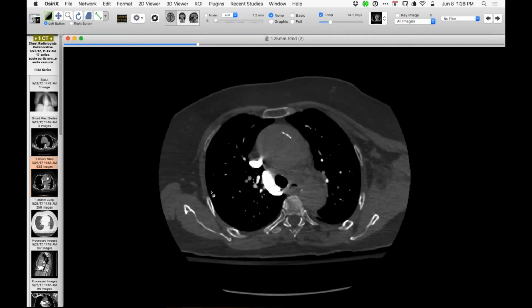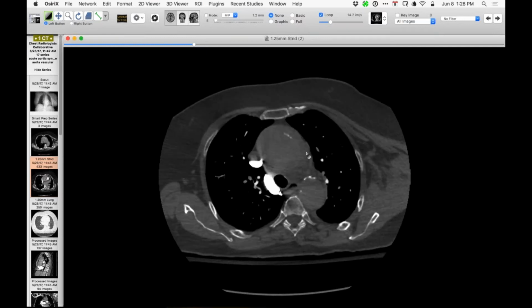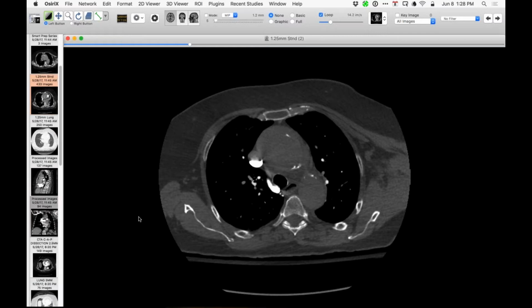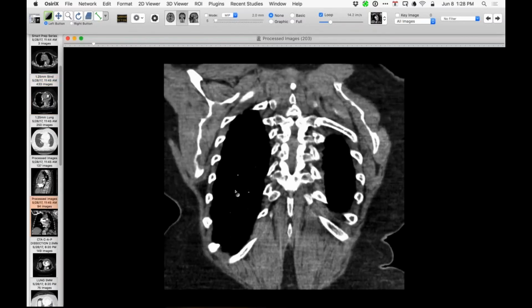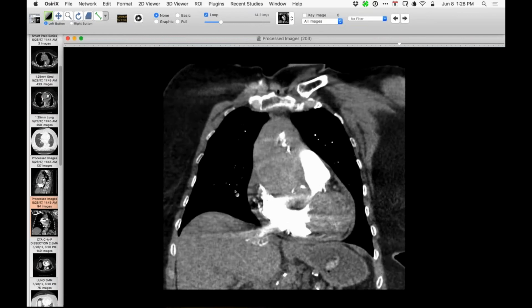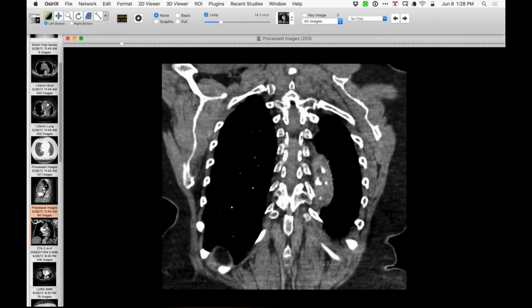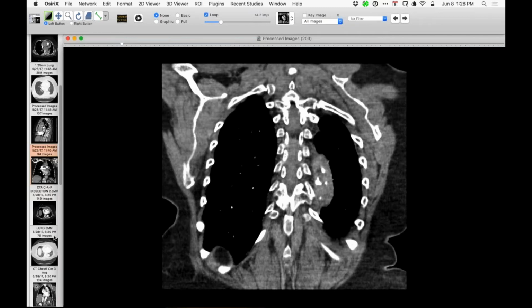Yeah. And I think even here on that CTA on the 28th, there's probably a little blood in the mediastinum too. You know, the more you look, the more you see the pathology that's present. So, Howard, putting this all together, I think that irregularity that you showed on the coronal view with aortic contrast is probably the source of this intramural hematoma. Somehow related to it. I think there's a little flap there, and that's probably how the blood got into the wall.